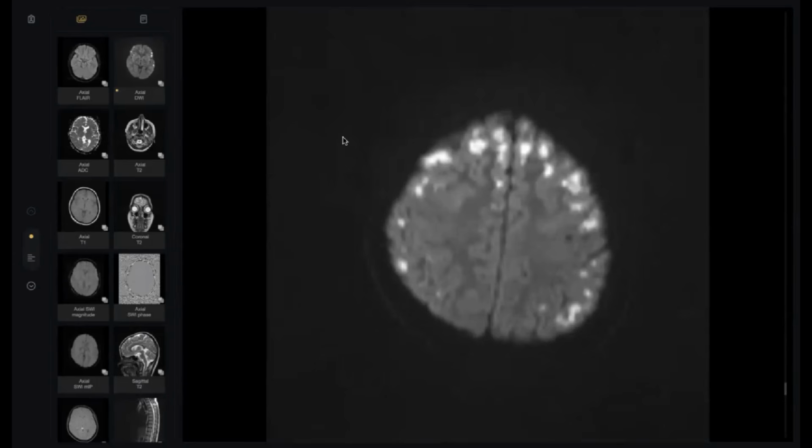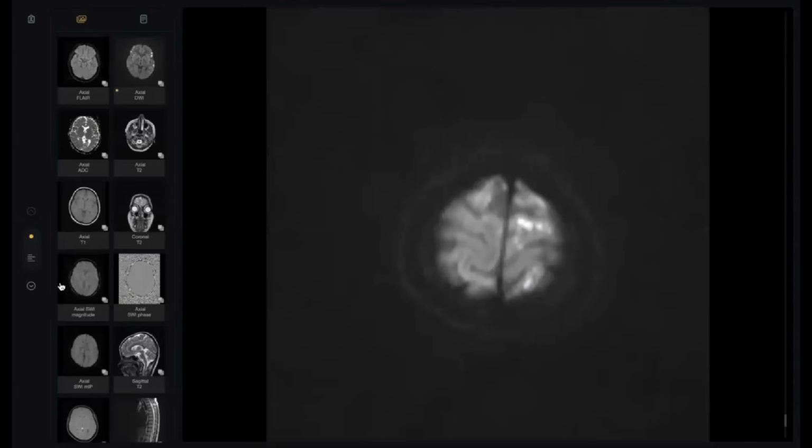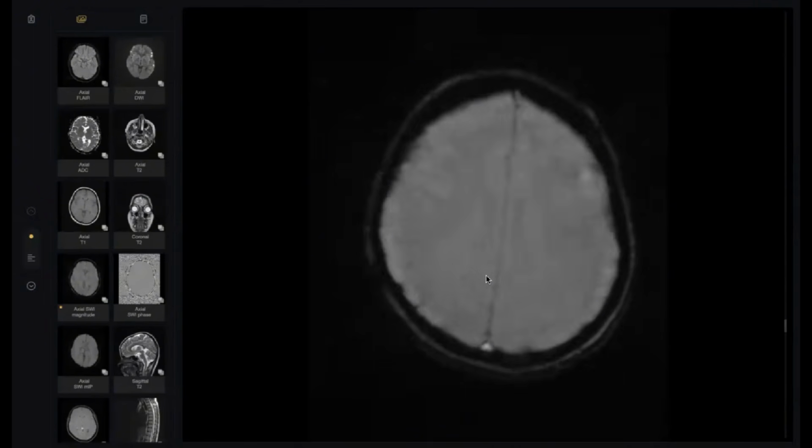In a real exam, the examiner will not give you this many sequences, especially in very clear cases or if the pathology is clear. However, I will give them to you in our session.